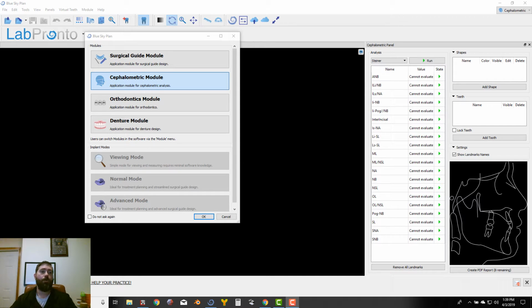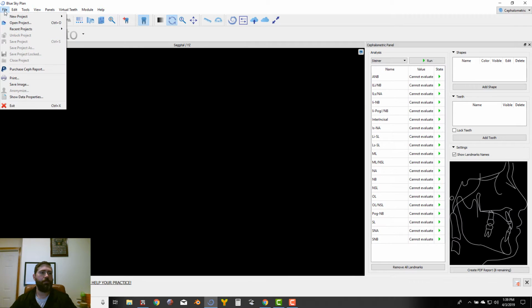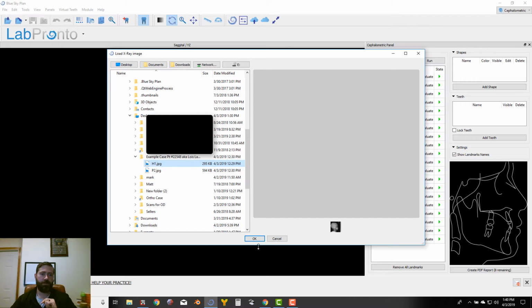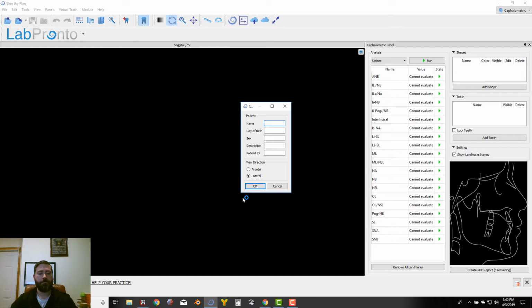So first off, we'll open up Blue Sky Plan just like you normally would and bring up Ceph mode and hit OK. And here we're going to open new project, and I am using JPEG because I have an actual Ceph unit, so I can export that as a JPEG. So I'm going to bring X-ray image here. This video is just going to demonstrate, bring up her Ceph here on Lois Lane, obviously not her real name, but we will pretend like it is so.